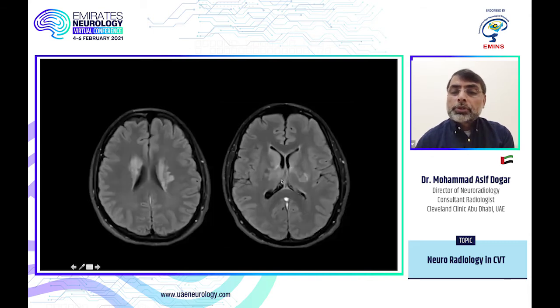On the T2 weighted, the FLAIR images, you see the edema in the caudate nucleus, here's the lentiform nucleus, caudate, the thalamus here. But the clue to the diagnosis is, look at the veins here. So this is hyperintense. Like it should be dark like this, like the superior sagittal sinus. But due to the clot here, you can see hyperintensity in the veins.